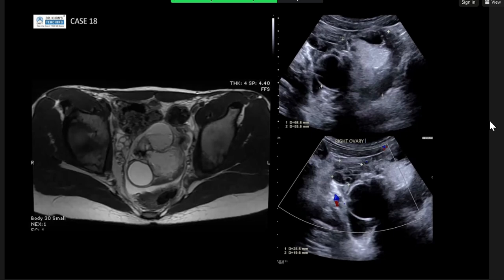I would like to do fat suppression imaging to further characterize the lesion. This is one of the things that you would probably come across in the exam, because it did come up for me in my exams. The reason I've shown this is that on the MRI you can see there are also areas of blooming artifact. On T2 you are thinking, is this blood products or is this calcification?